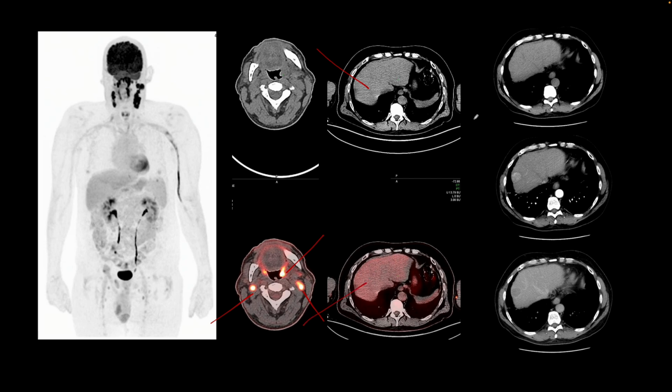They also, around the same time that they were diagnosed with head and neck cancer, had a CT of the abdomen and pelvis, which showed a lesion in the liver that was evaluated with multiphasic CT. On the non-contrast enhanced phase, we find that the tumor at the dome of the liver is iso-intense. On the arterial phase, you can see here the aorta is opacified. The tumor shows uniform arterial phase contrast enhancement. And in the delayed phase, it shows washout and a peripheral pseudocapsule.